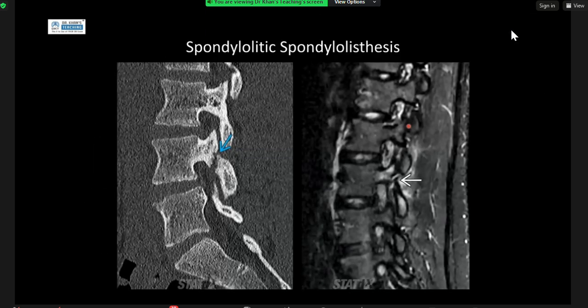Other examples of stress-related injuries is pars defect. Here in kids, not always, you get the slippage or the listhesis, the anterolisthesis. You know why? Because this thing sticks out a bit, acting like hinges, so protecting this from slipping forward. When you lose that little grip between the bone edges, this whole thing slips forward. That's why I've got an anterolisthesis of the upper vertebra relative to the lower vertebra.